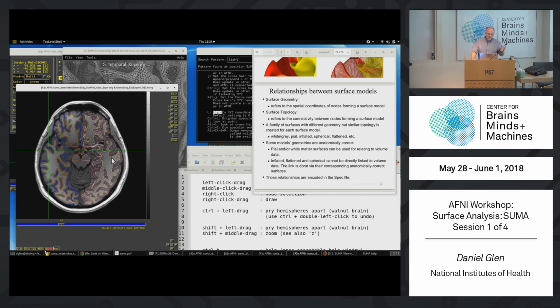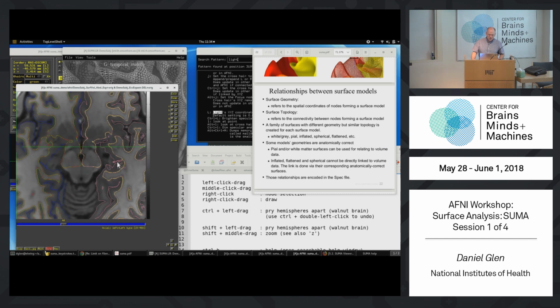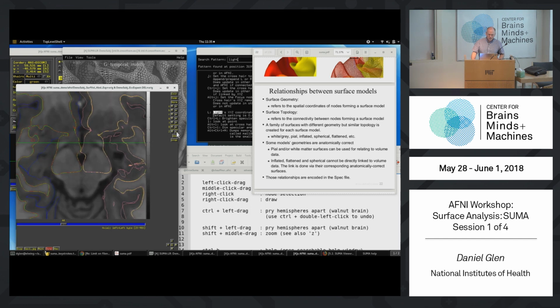And so for cases where you have lesions, some of these things aren't very good. And if you need to be precise, some things are very strange where it's twisted up in there. So you can find some problems like that just by looking inside AFNI for the twistiness of the places like that.